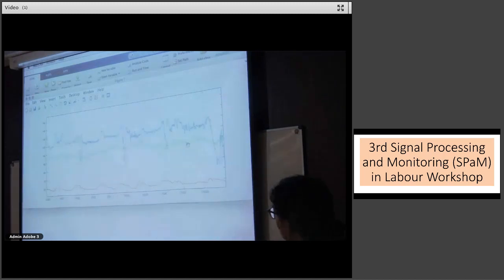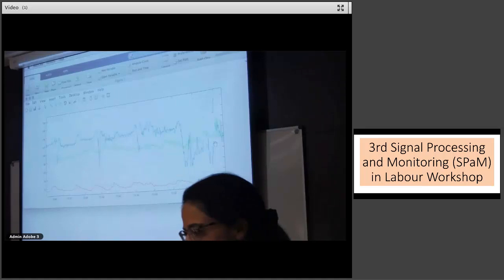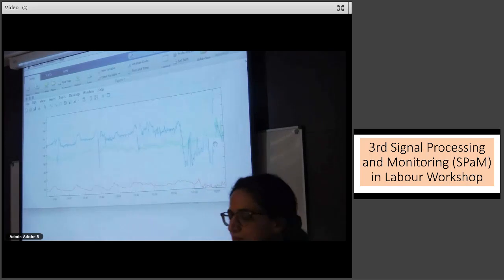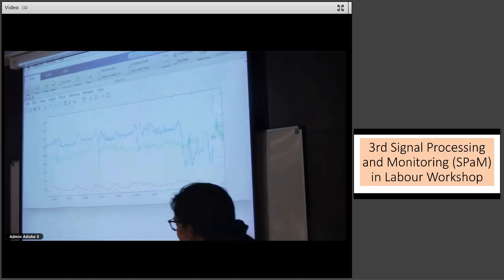Let's move on, please. So here, Austin, do you want to comment here, please? I'm still very happy, but I agree with Barry in terms of not necessarily the contraction frequency. That's not the issue, but it is the duration of those contractions. If a mom is contracting 3 in 10, and each contraction is 45, 60 seconds, that baby is in a different state compared to when those contractions are at least a minute and a half.